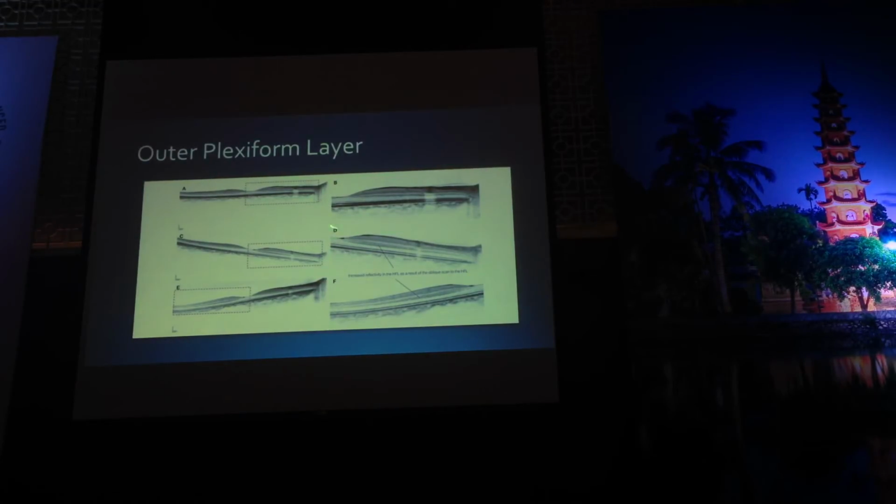in this figure B, the beam of the OCT runs this way. It's not perpendicular, it's kind of oblique, touching the Henle fibrous layer here. But when you tilt the eye this way, the Henle fibrous layer is kind of perpendicular to the OCT light here.